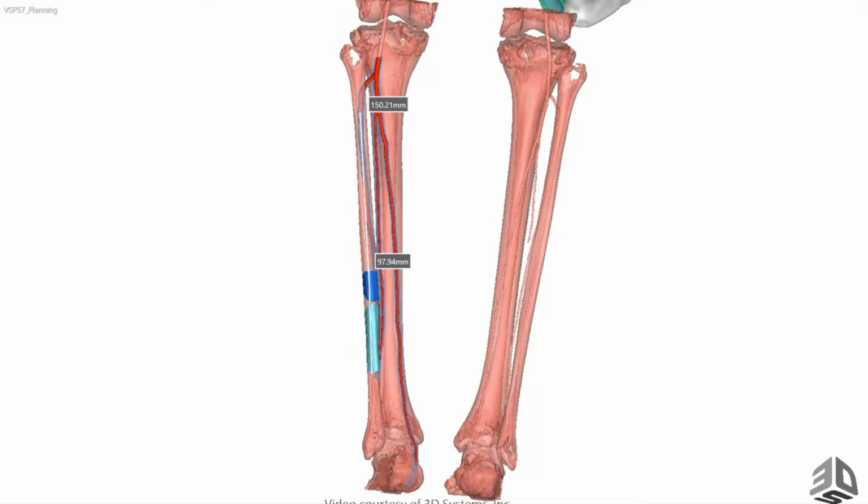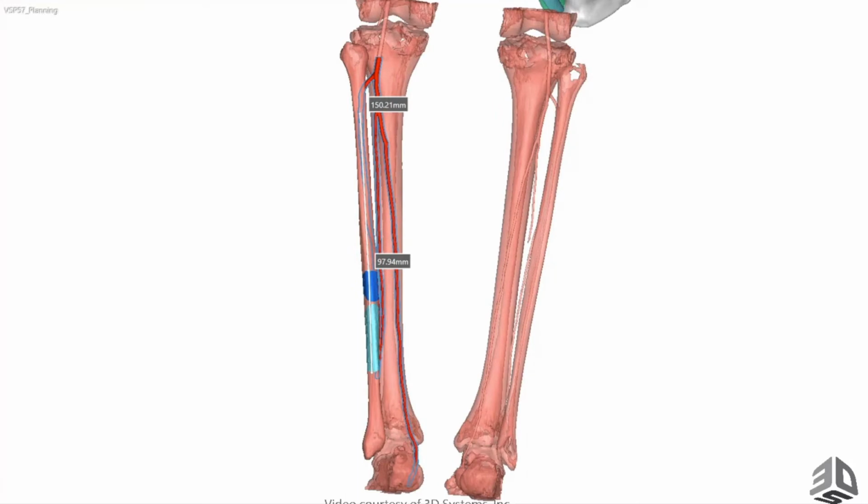What I routinely do with my trainees before surgery is that I get them to look at the scans, and we'll count the number of slices. You'll have a measurement of the number of slices from the very proximal tip of the head of the fibula all the way down to the furcation point, and that will give you an idea of what sort of length you'll get to your pedicle before you start surgery. And that's just getting an eye in as to how proximal your incision needs to be, how proximal your dissection has to be, so you use the full length of that peroneal artery before the tibio-peroneal trunk.